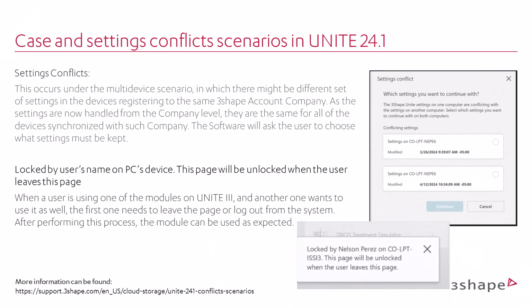Settings conflicts. These arise in a multi-device scenario when different devices registered to the same 3Shape account company have different sets of settings. As settings are managed at the company level, they are synchronized across all devices linked to that company. The software will prompt the user to choose which settings to retain.